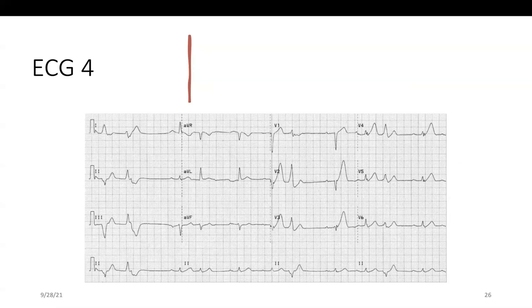ECG 4. Anyone? Forget about the BBC. Look at the ECG. What do you see? I've just mentioned that. Is this hyperacute T wave, Doctor? Exactly. There's hyperacute T wave where? Which lead? V2, V3 mainly. V2, V3, exactly. But there is again V4, exactly. There's in V4, there's in V6, because always take it in relation to the R wave.